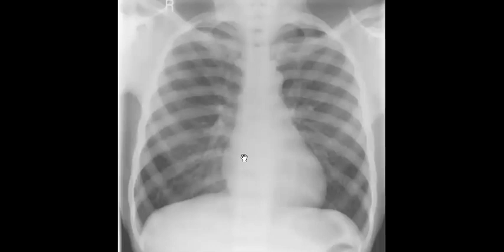So what else will be the differential? Will be something like osteopetrosis. We mentioned it, but this is in young age, in pediatric age group. In adult, renal osteodystrophy. Perfect. Renal osteodystrophy can happen either in child or in adult, but it has the appearance of rugger-jersey spine, subperiosteal bone resorption. You will search for these things, and in the history of this patient, you will search for any hemodialysis.